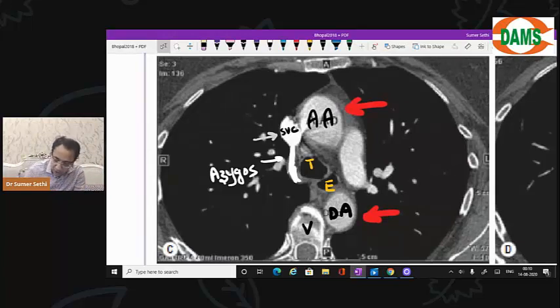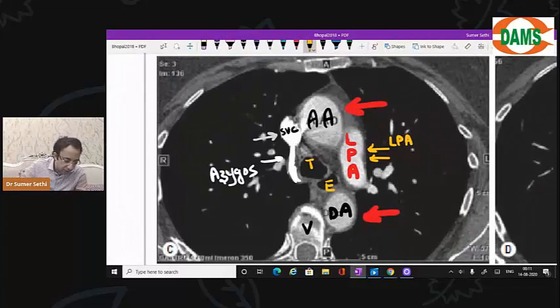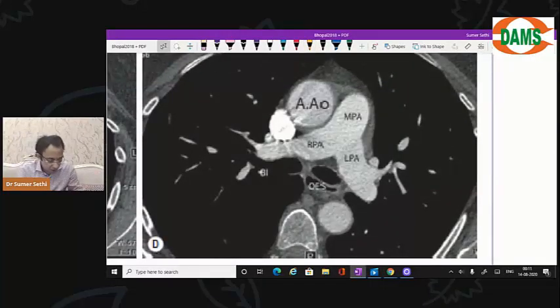Another thing to understand here is, this is the left pulmonary artery. We can start seeing the left pulmonary artery before we see the right, because the left branch arises higher than the right. So we can see the left pulmonary artery already. Okay, beta, we just have to finish these 4 images, then we will go home. Now, the esophagus is an air-filled muscular tube, beta.